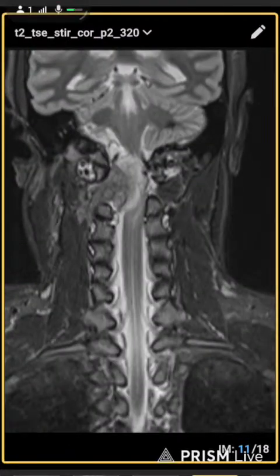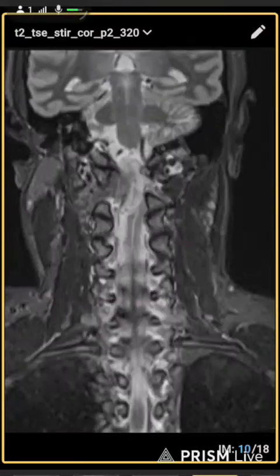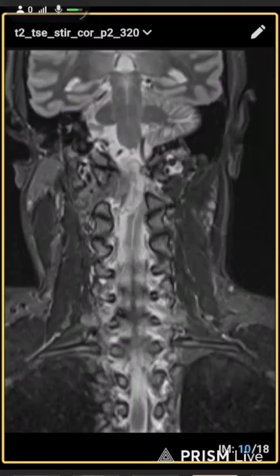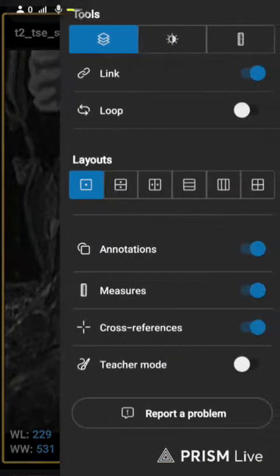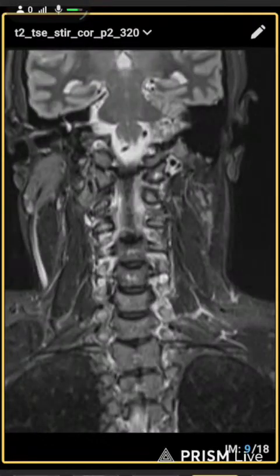In STIR we will find out more details than in T2 or T1, just because STIR has higher signal, and it also suppresses the fat, so if there is a lesion, it's properly visualized in STIR. You can differentiate the area of the tumor in the plain scan with the STIR. You can see the narrowing pass through, and after this area it is totally involved by the tumor.